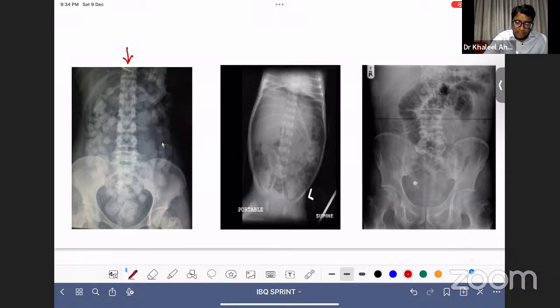Very good, Rishabh. You are seeing this is a body packer. So latex bags are there, which are containing the drugs, and these are all filled up in his intestine. You can see them here. This is a body packer, a smuggler who is carrying these latex bags containing the drugs within him. So this is how body packers would appear. And what is this sign showing you?